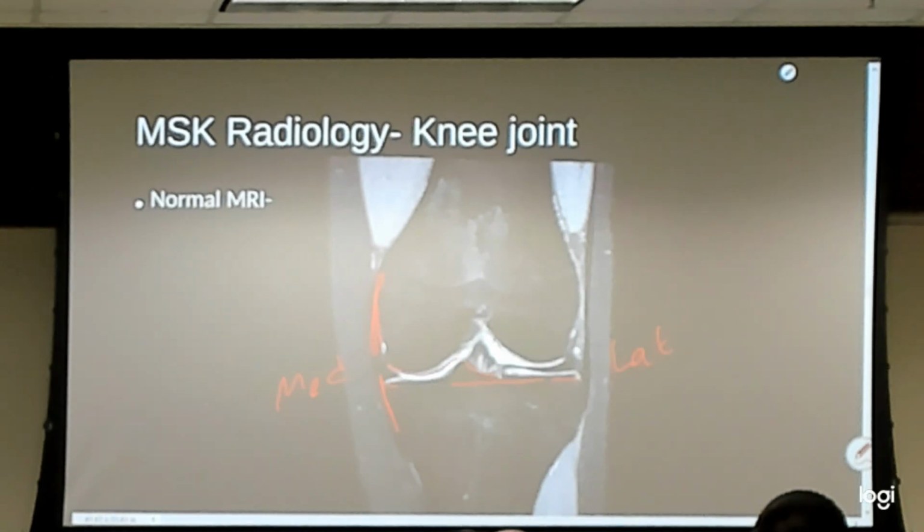A little bit more obvious on yours. How would I describe that? Mid-gray? Sure. Just said mid-gray. We'll throw out shades of gray right now. Cartilage.